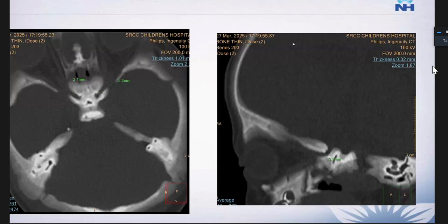Considering that there is some sort of thickening and sclerosis of the skull vault and skull base area, mild optic nerve canal narrowing has been noted. There is evidence of tonsil ectopia and ventriculomegaly, which can be secondary to narrowing of the outlet foramina of the skull base, leading to secondary ventriculomegaly. So any thoughts? Yeah.